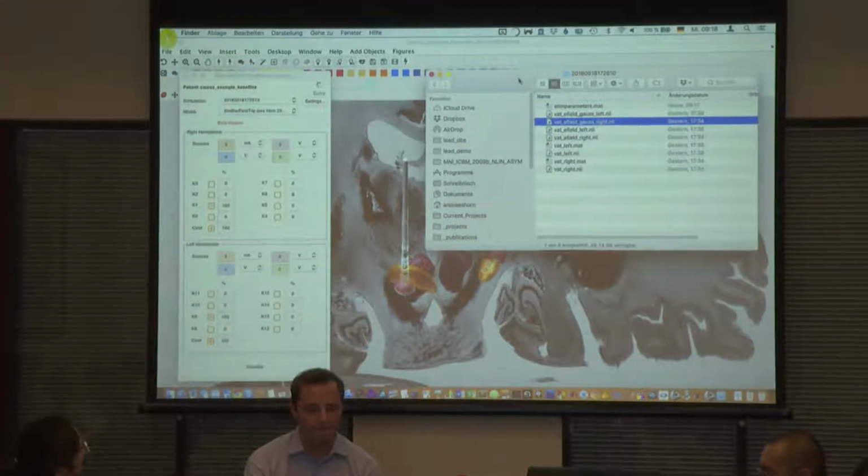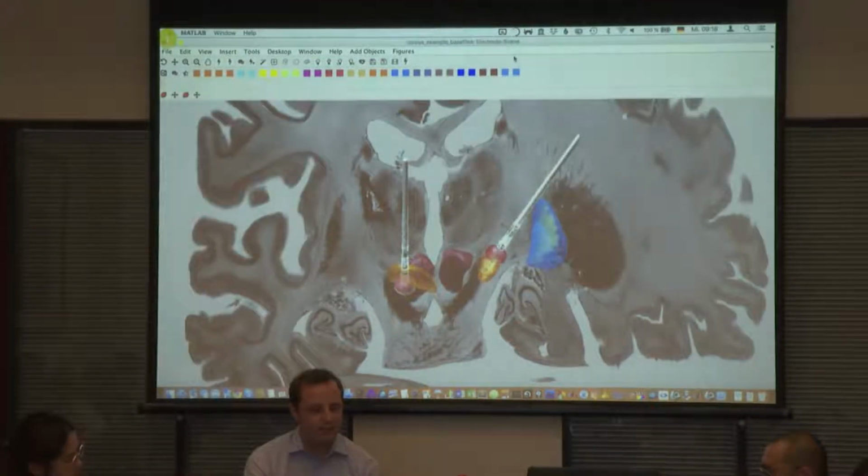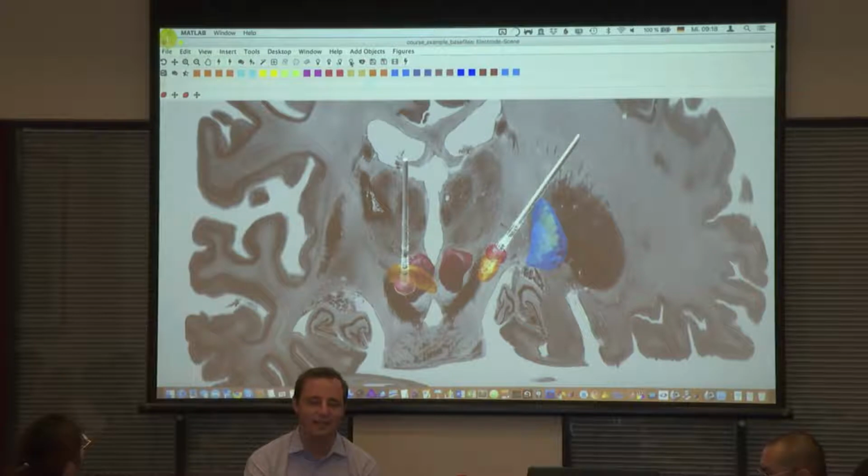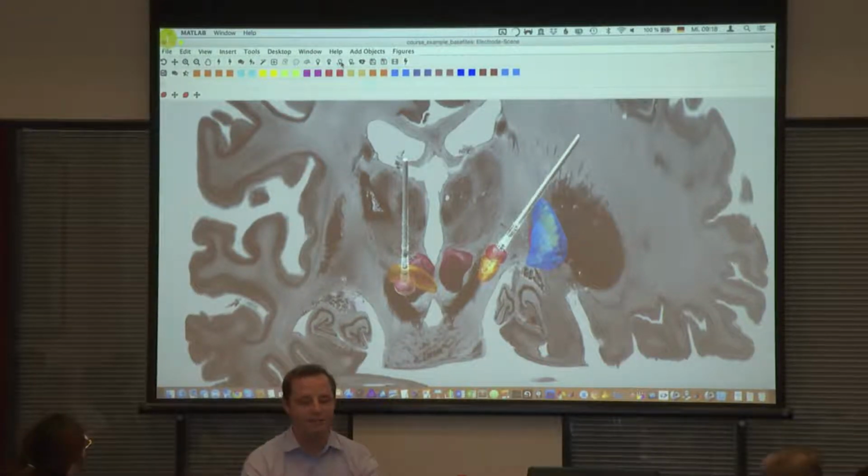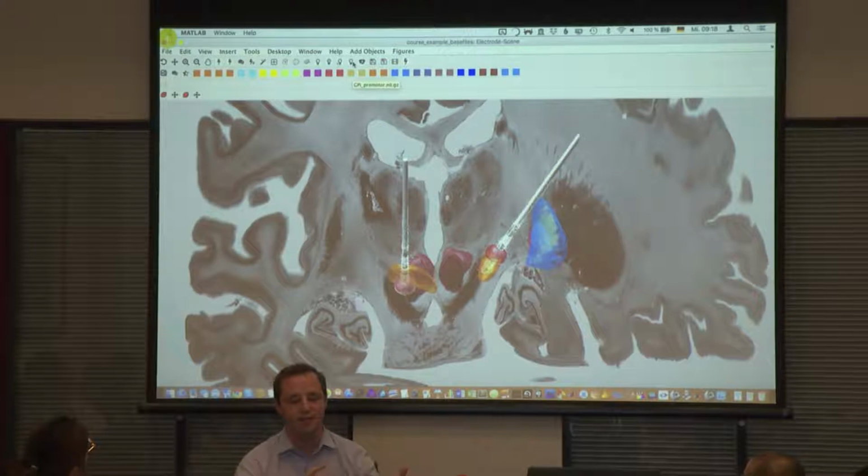So that's that. Then maybe some more smaller things. Up here we have some buttons for lights in the scene, right? So if we declick these light buttons, then the scene will change a bit and the lighting will change. So sometimes if you make a figure for a paper or so, this can really make a difference.